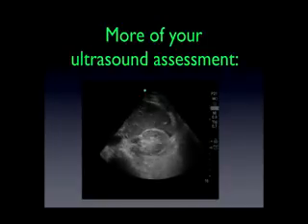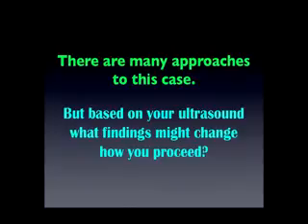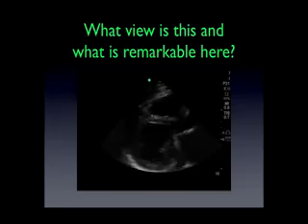As an additional part of your ultrasonographic assessment, there was another ultrasound performed, and this one of the abdomen. And again, take a look at this, and we'll review this in short order as well. Now again, to emphasize, there are many approaches to this case. But based on your ultrasound, what findings might change how you proceed? Again, this doesn't mean that we proceed definitively in this fashion, but this is to illustrate how an ultrasound can change your clinical judgment as to what is exactly going on in this case.